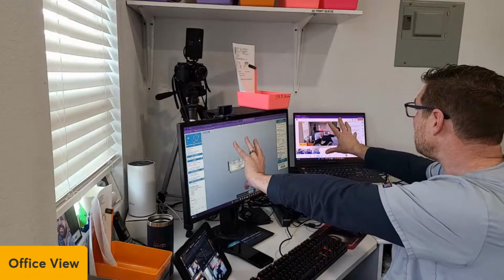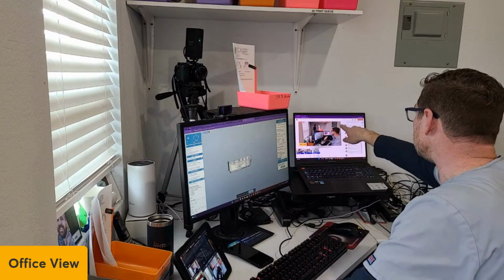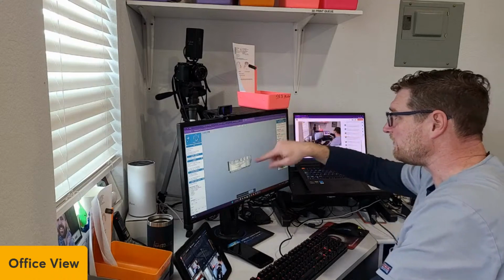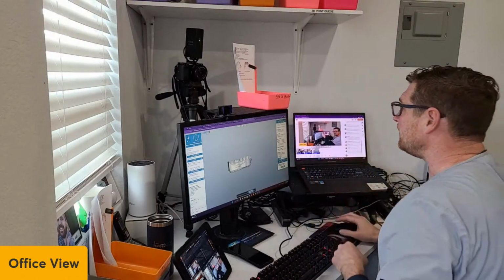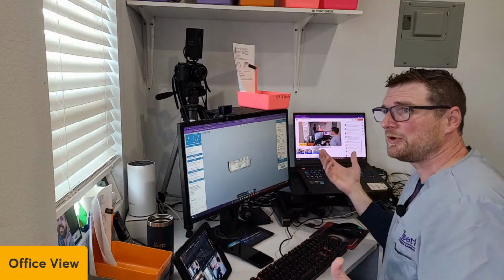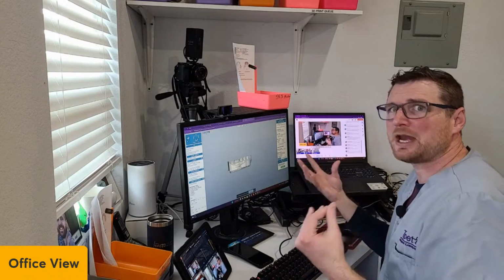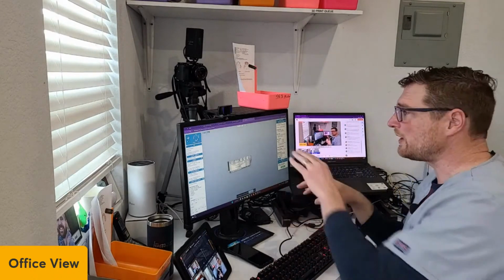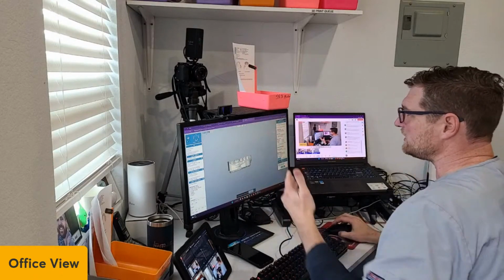I'd have it over here, and as I'm waiting on this to process, I start another one over here. And then while I'm waiting on that, I finish this up, and I just go back and forth, and you can get a lot done while you're doing it. But now that they've come out with the auto basing, and it does about 70 or 80% good job, I rarely need to. Like this one, I have to do the lower, and it's fine. It doesn't take too long.